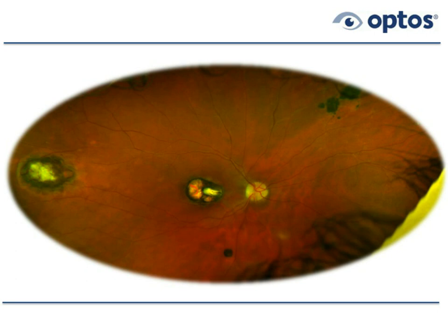So here's the image. We have a central macular lesion, which is typical. We have some peripheral lesions, which are also typical. There's one large peripheral lesion in this right eye, which is out temporally at about 9:30 or so.